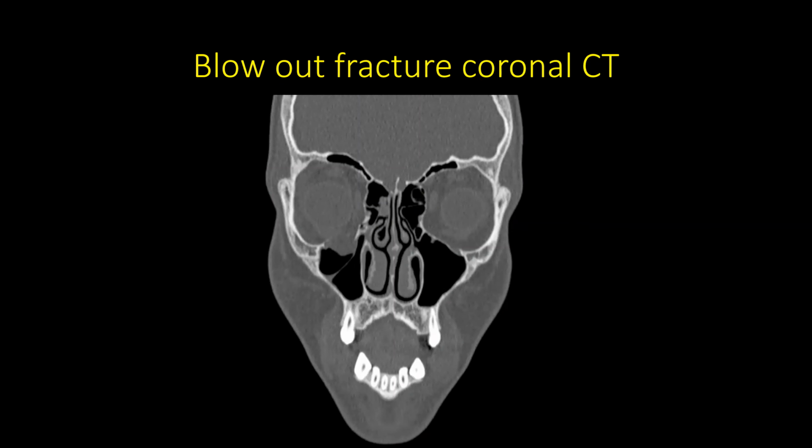Now, if you look at the CT scan of the face of this patient, on the left side, which is normal, you see the superior wall, medial wall, lateral wall, and the inferior wall. And if you look on the opposite side, a bone fragment has gone down. You'll see in another slide a better one. The fragment is very well seen. So here is a fracture here. And if the fractured bone goes out, this is called a blowout fracture.